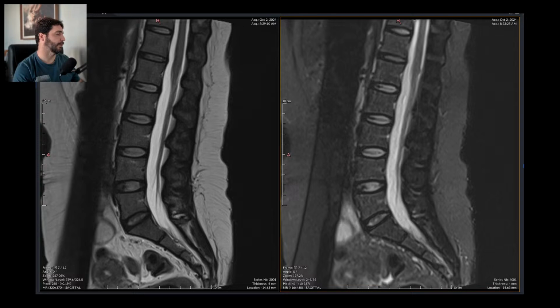I have a template quite like this. Just going to add the annulus fibrosum ruptures. Yes, no protrusions, but I have degenerative disease and synovitis.